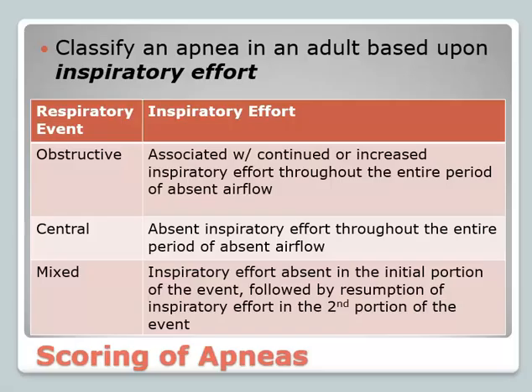A central apnea means that there's no drive to breathe. So when you look at the respiratory belts, there's zero effort to breathe as well. Those are flatlined as well. When you're doing biocals and you have your patient hold their breath, that mimics a central apnea, right? Zero airflow, zero effort. A mixed is a combination of the two. Starts off as central, ends as obstructive.